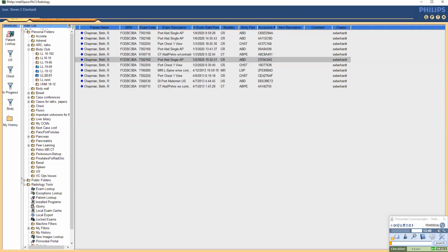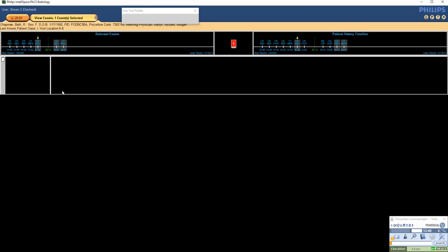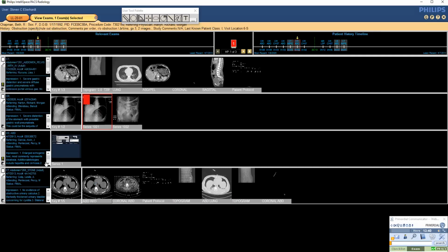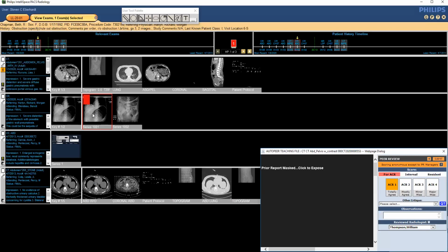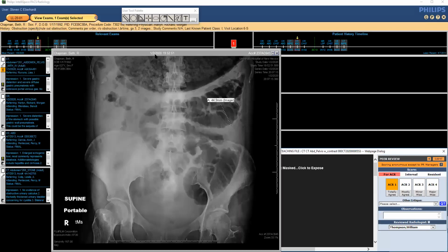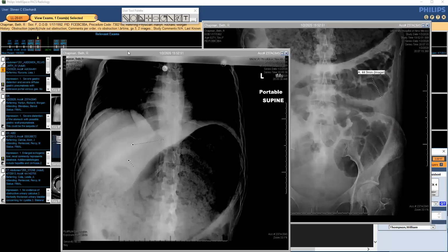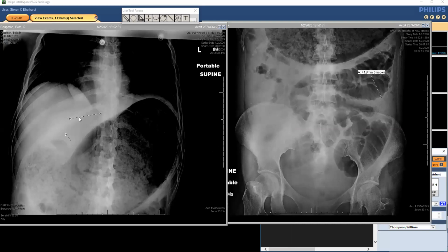Remember, this is a pseudonym. It's not the correct MRN. This patient has prior imaging history, but the imaging history for our purposes starts here. It was a patient that was admitted for, I should get rid of these arrows.